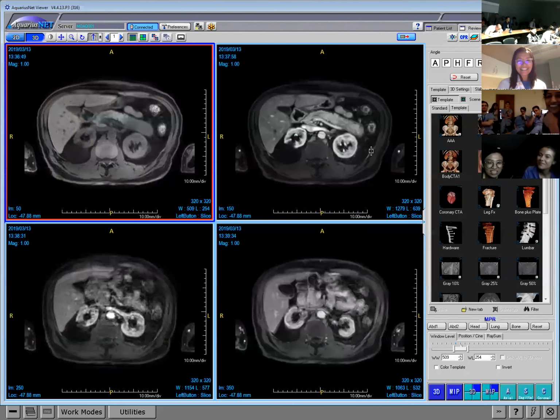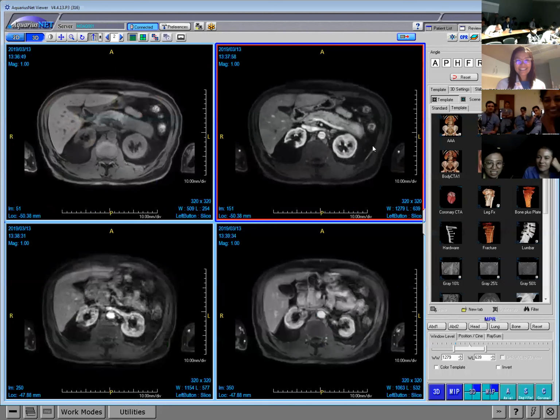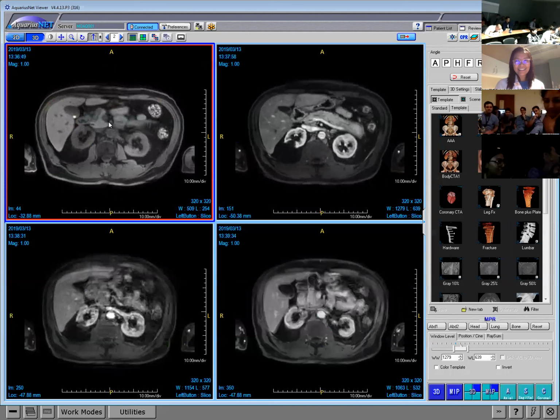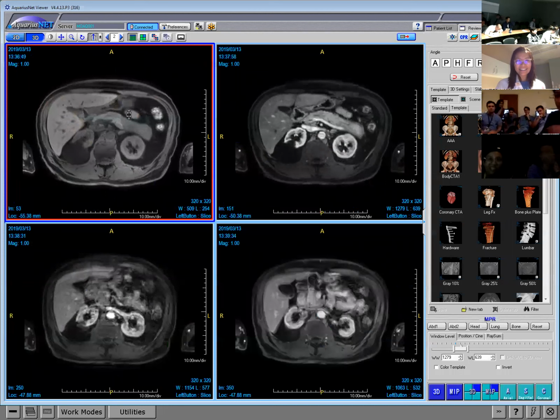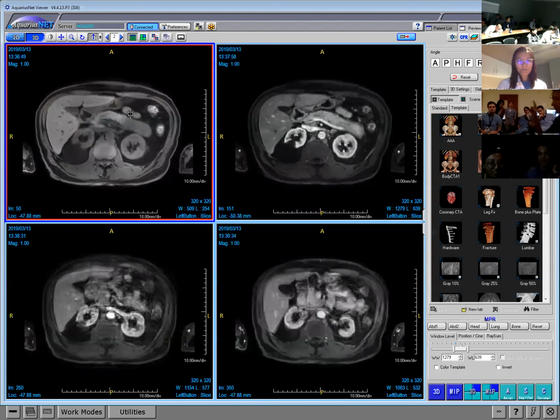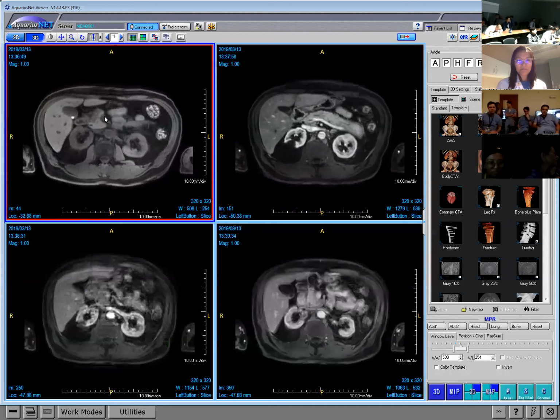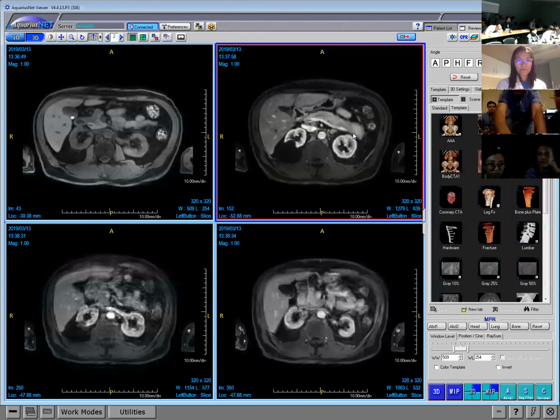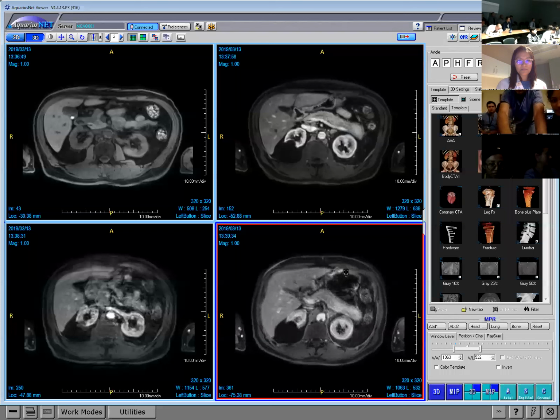But you can see that now the appearance is very striking, right? So on the pre-contrast T1 weighted sequences, which is a great way to look at the pancreas, you can see very sharply demarcated abnormal signal intensity in the tail. There's also another area here in the head. And then you can see this rim-like area of hypoenhancement. The patient pooped out at the end.